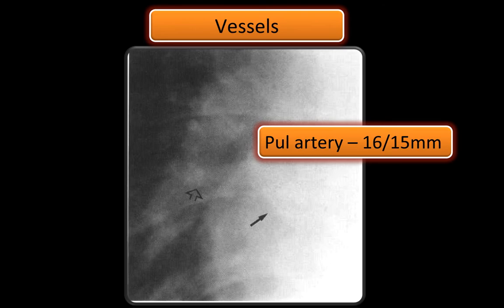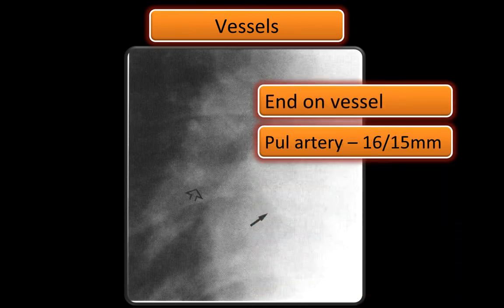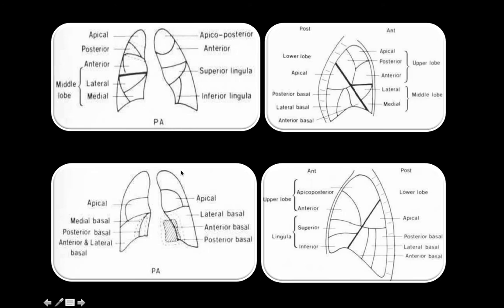So this thing is very important, but the usual radiologist looks only at the bones and the lung fields. The hila, the pulmonary vessels, the heart, these are quite detailed information that we usually do not find in the reports. Okay, end-on vessels. I told you that the white spots are end-on vessels, and they contain blood, so they are white.